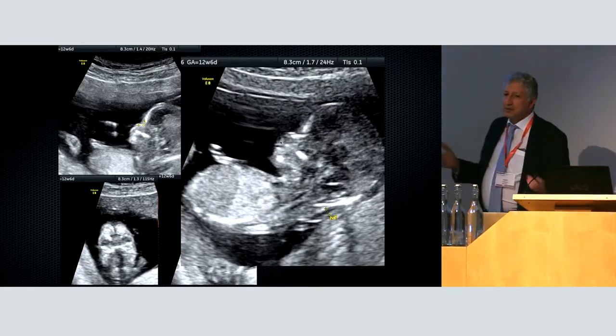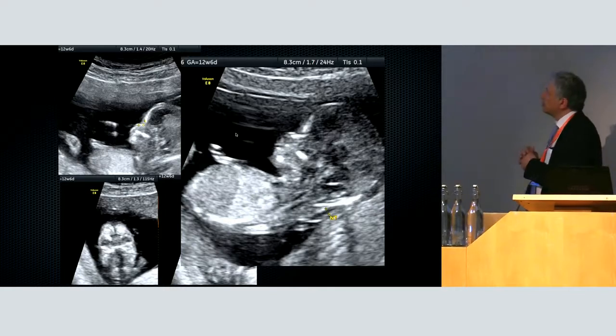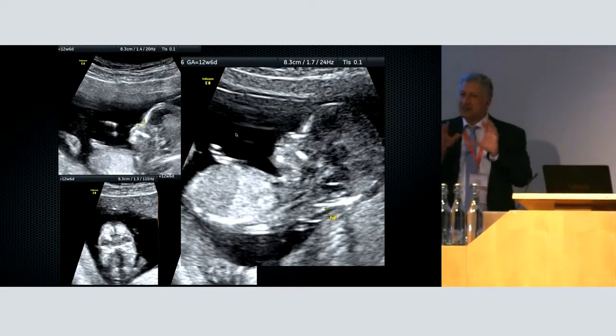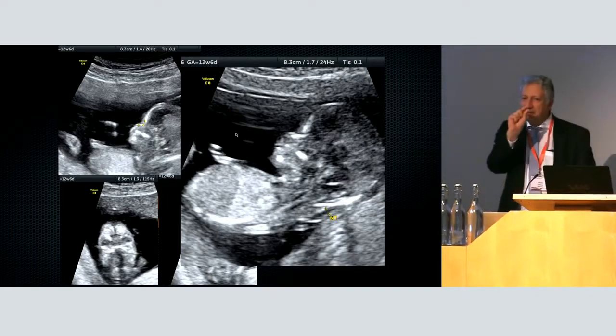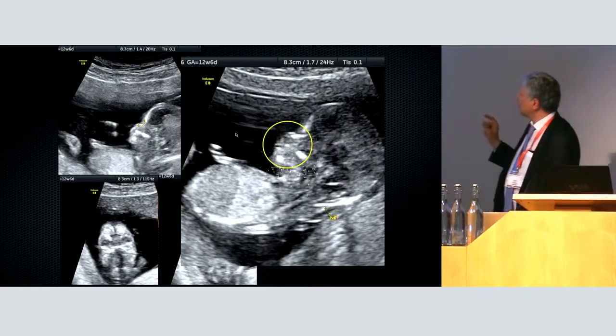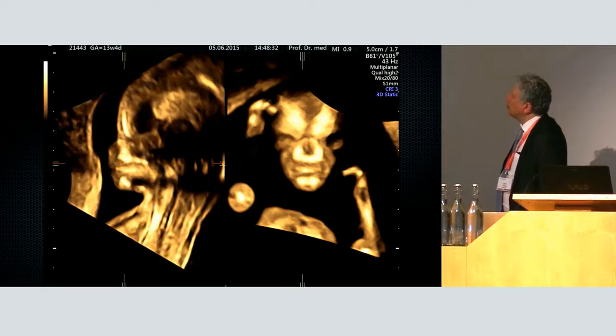There is half of the maxillary is not there, and this is something I show. You can see it posteriorly, and this is why when you return home, take 5-6 cases not seen in early gestation, and look at the images. You may find on this and that some part of, let's say, of the maxillary gap. So the sign should be easy. This is how I learn doing things.